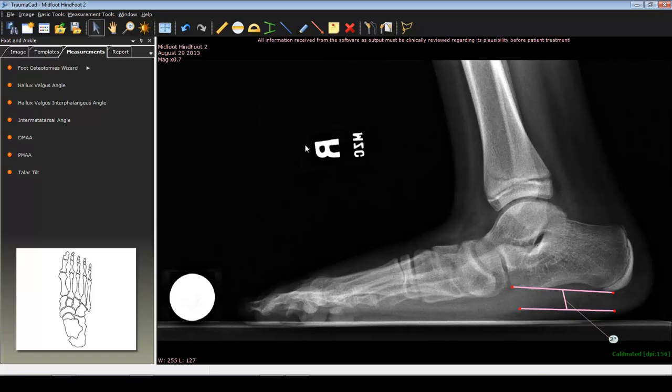Now, the fragment that you need to identify is the talus and the calcaneus, and you start off by clicking Define Fragment, which is on the top of the toolbar. And as I said, when you correct this, you want to go through as many data points as you can, especially when you're going through an articular area. We're going to start off right here on this articulation of the ankle, and we select all these data points, and we go around the calcaneus.